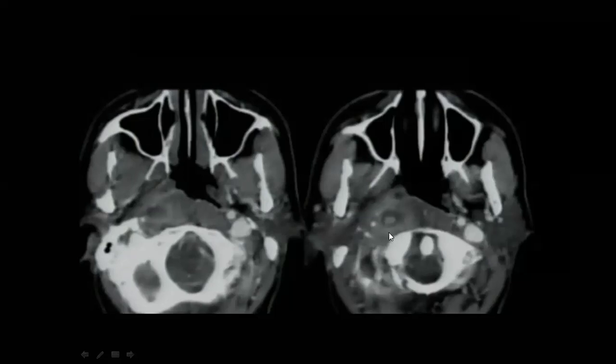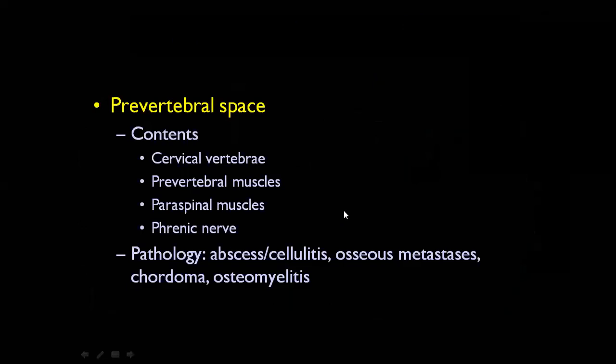So you should put differentials and check the case, and we can see that there is a lymph node. So this is, sorry, Rouviere, yes, Rouviere. Suppurative lymph node of Rouviere, one of the commonest lymph nodes here that you should check.